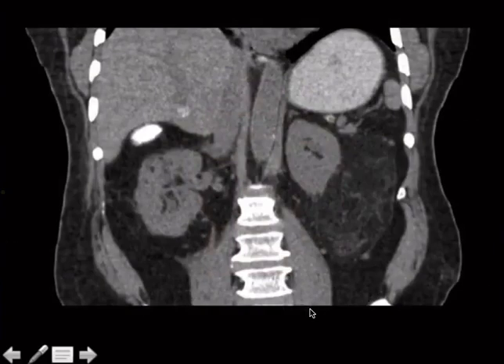All right, here we go. Coronal plane gamesmanship. When you see the coronal plane, you think about three things: kidneys, bile ducts, spleen. Those are the three pathologies that are most easily shown on this cut. Now, if you're cut forward, they can show a bowel obstruction. It's a good way to show a bowel obstruction, I think, in coronal plane. But the cut that's further back, more retroperitoneal cut, is going to be kidneys, bile ducts, spleen. So that's the things that I look at on this cut.